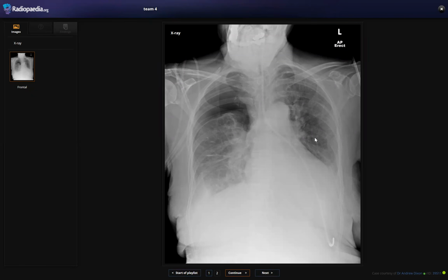There is evidence also of a nasogastric tube that's passing in an abnormal direction. It's moving to the left side and then going downwards. So this is maybe a malpositioned nasogastric tube passing through the lung to the abdomen, upper abdomen. And I need to inform the clinician about this and ask him to retrieve this one. And I need to also check for evidence of fractures.